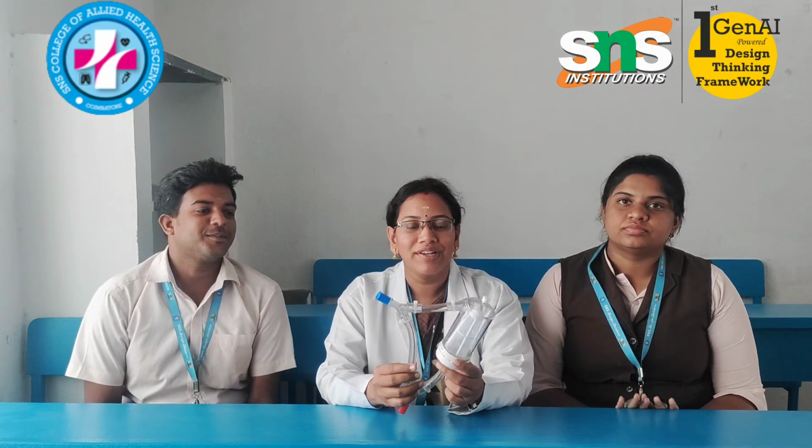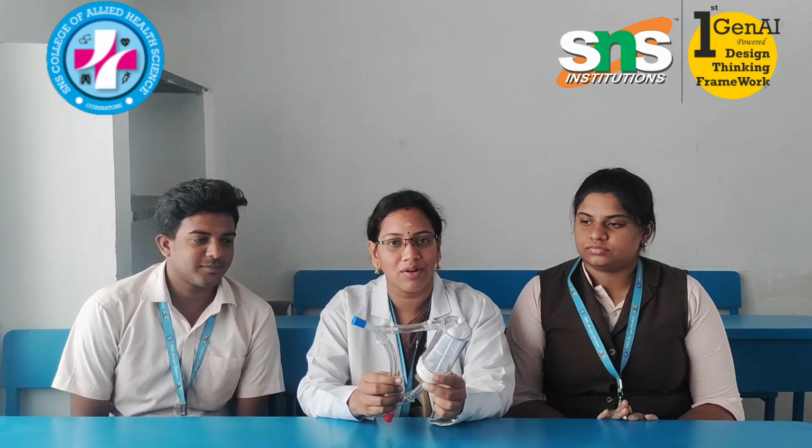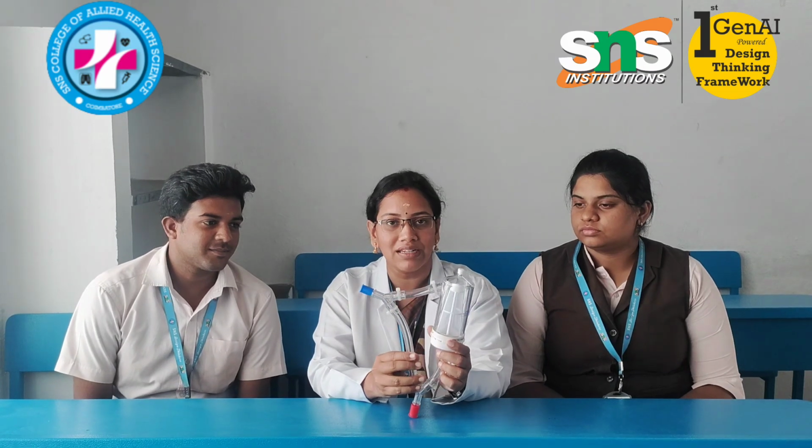Good morning all, we are going to see a topic on the bubble trap. The bubble trap is an important safety device we use in an extracorporeal circuit. As already mentioned here, it is a split-draw adult bubble trap.